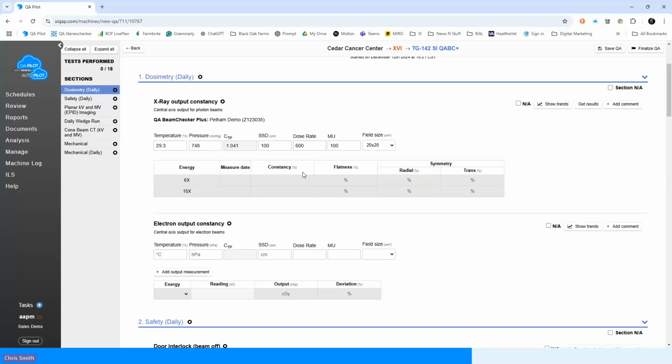You would be able to pull in all this information and start to either verify, check, or ensure that it was meeting your tolerances. And then I'll talk a little bit about the tolerances that get populated in here. But this is a part of the setup process. If you think back to what we were talking about, getting us up and running does take some time, right? We need to set proper tolerances for your daily devices, whatever your current tolerances are for your product, and then set them in when we actually start to add pieces of equipment to your equipment hub.